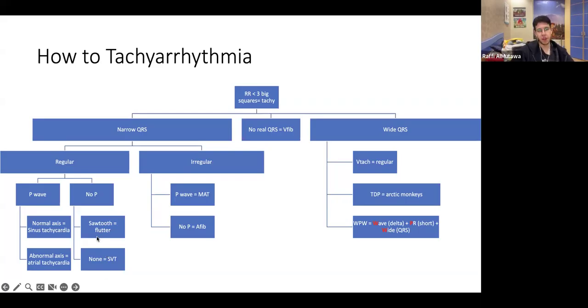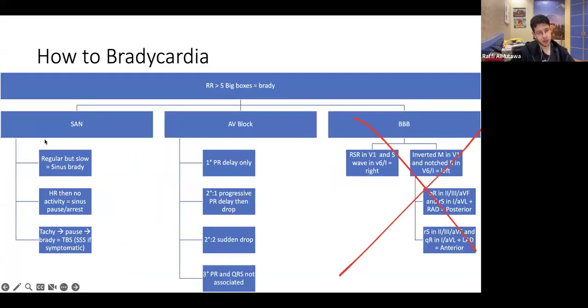Right then, for example, we're not going to see a P wave here in these two. So we know that there's a problem with the sinoatrial node or the atria, right? And then with the ventricles, because the QRS is wide, this is going to tell us, okay, great, the problem is in the ventricles, whatever it may be. And then if we look at the sinoatrial node, again, because it's essentially just sinus. So when we say the word sinus, we mean like the normal heart rate. So it's just going to look completely normal, but the sinoatrial node's acting up.